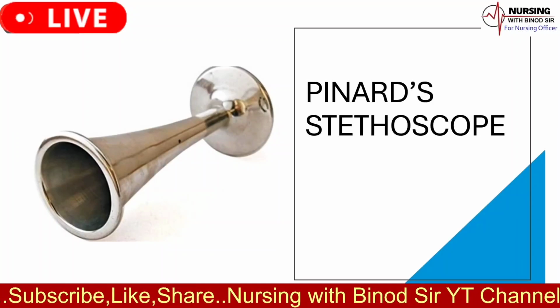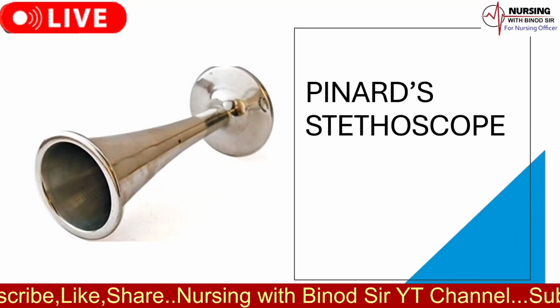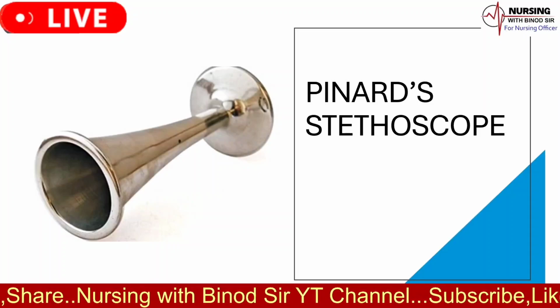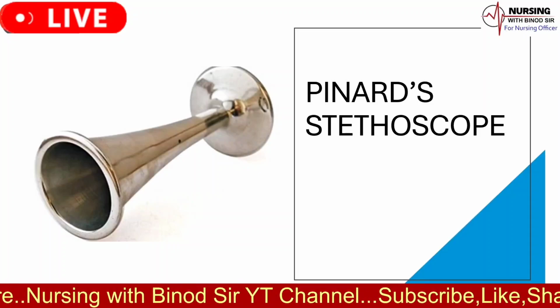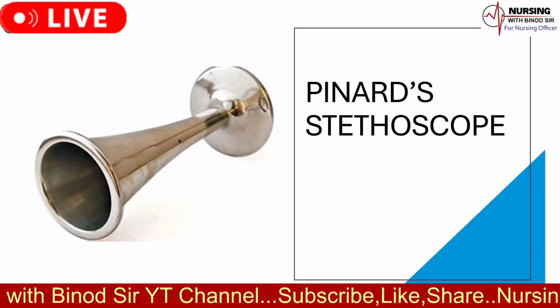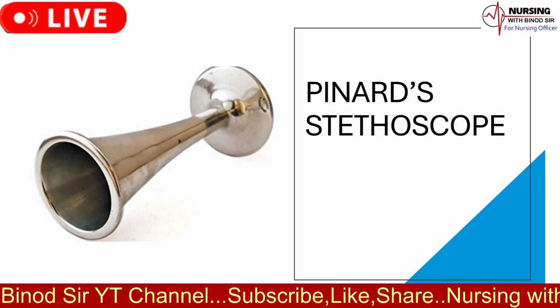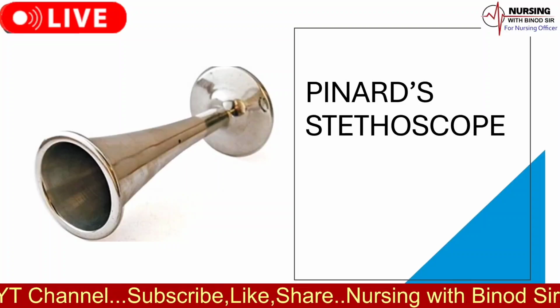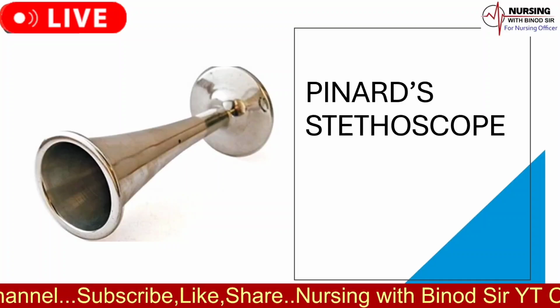The name of the instrument is Pinard's stethoscope. The uses of Pinard's stethoscope is as follows. Fetal heart rate monitoring. The primary use is to listen to the fetal heart rate during pregnancy. It helps healthcare providers assess the health and well-being of the unborn baby.